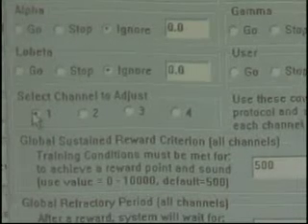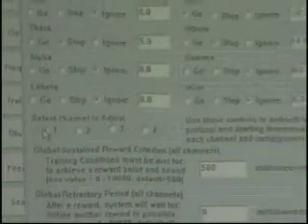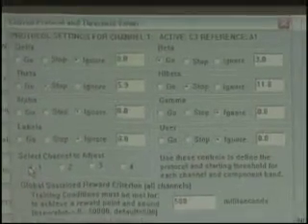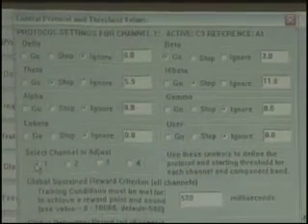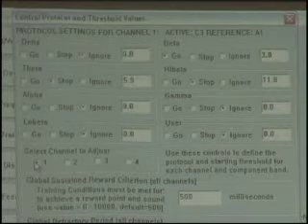The other thing I've seen people do is click by accident one of these channels, make an adjustment, and only have the adjustment on channel 3 only. And then channel 1's not what they wanted. So you have to be aware of what you're doing.